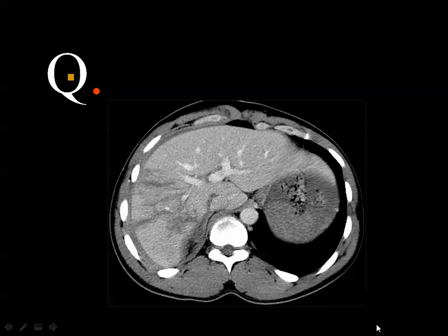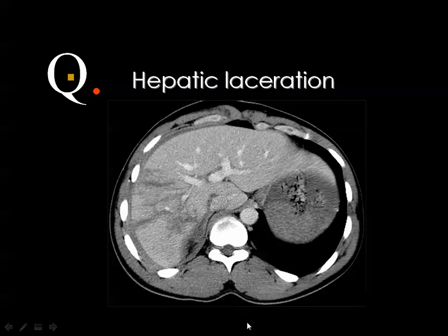Yes, and this is a CT scan of the abdomen with intravenous contrast injection, multiple linear hypodensities within the liver parenchyma of the right hepatic lobe, diagnostic of liver lacerations, and you should say that there is some collection or fluid in the peritoneal cavity, diagnostic of hemoperitoneum. This is of course the stomach. The spleen is not yet in the section. This is hepatic laceration with the hemoperitoneum.